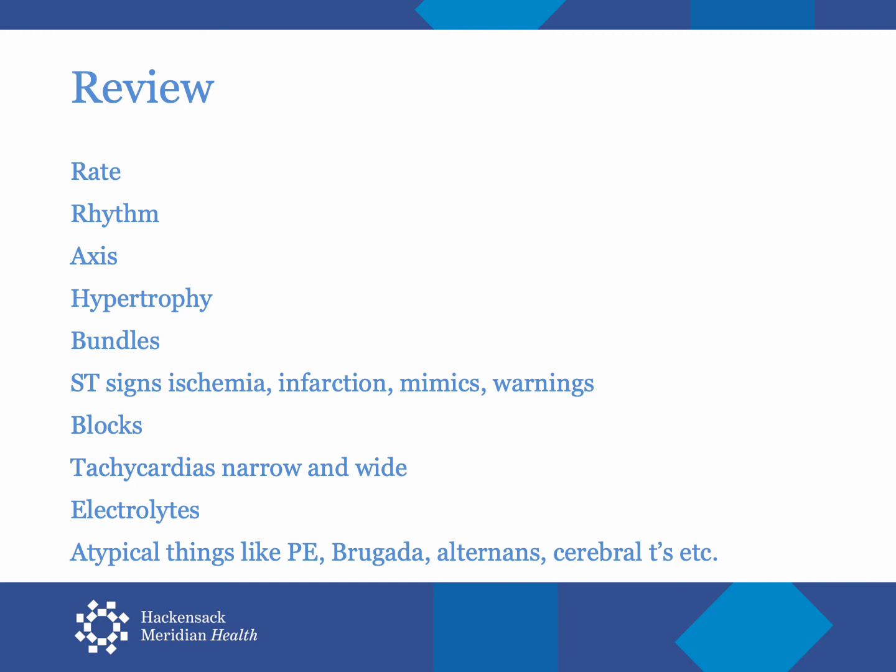Tachycardia can be the most frightening and separates to narrow and wide complex tachycardia. Narrow complex tachycardia needs only to be separated into sinus, SVT syndromes, and flutter-fib syndromes as far as treatment. The wide complex tachycardias can be either a ventricular tachycardia or an SVT with aberrancy, and there are numerous clues to help you determine what is really VT.